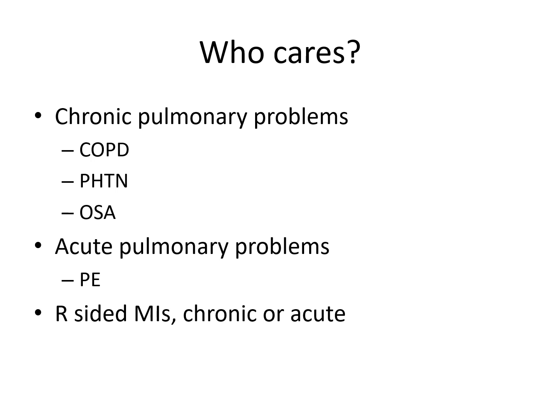Now, who cares if there is a right bundle on the ECG? Well, a lot of them are normal, especially young females can have a right bundle in the absence of any actual problems with their heart.